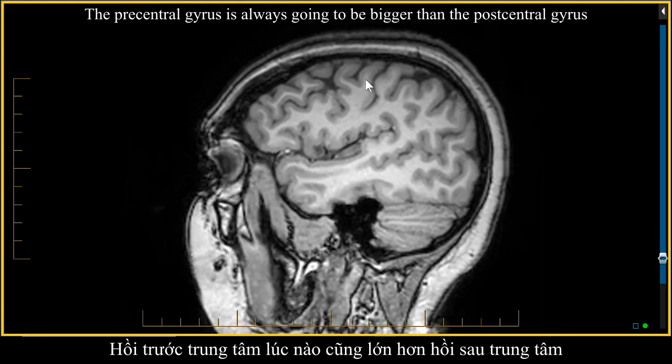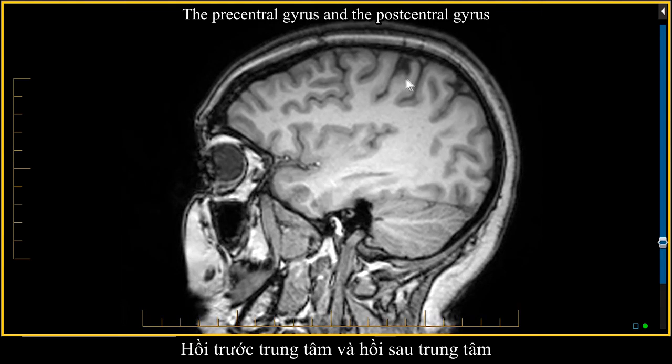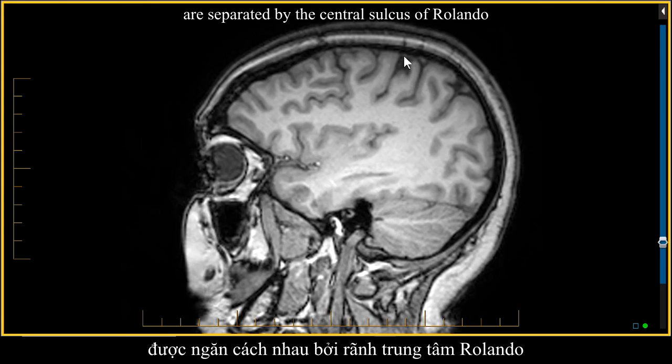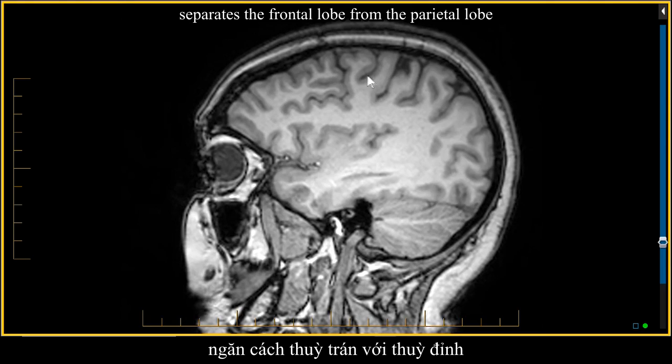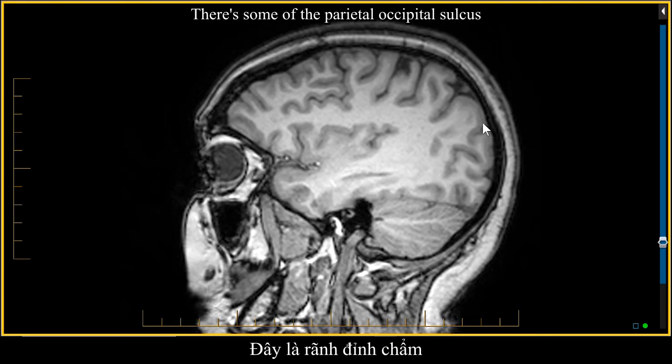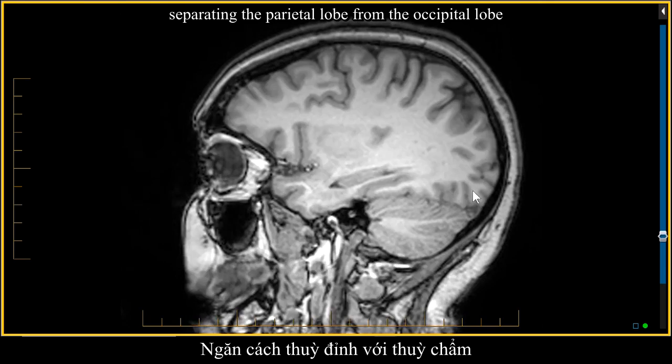The precentral gyrus is always going to be bigger than the postcentral gyrus. The precentral gyrus and the postcentral gyrus are separated by the central sulcus of Rolando. The central sulcus of Rolando, up and back, separates the frontal lobe from the parietal lobe. There's some of the parieto-occipital sulcus separating the parietal lobe from the occipital lobe.